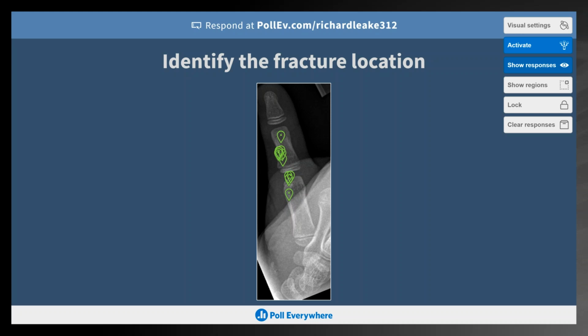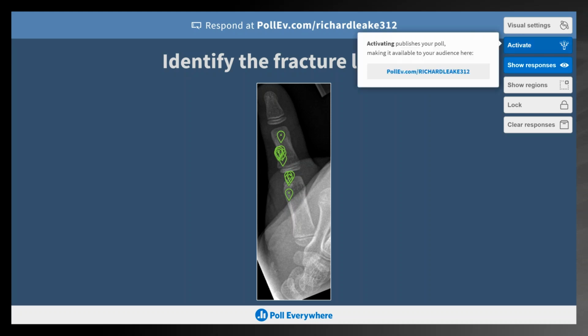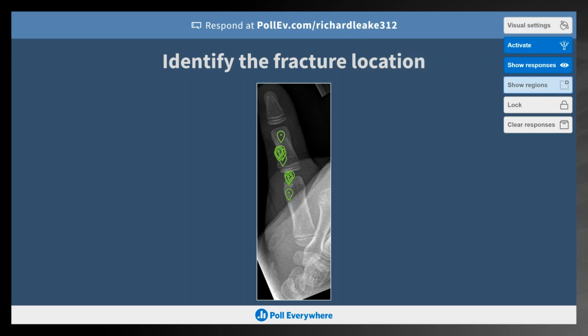All right. Let's show this region. That's where the fracture is. We'll go to the next slide.